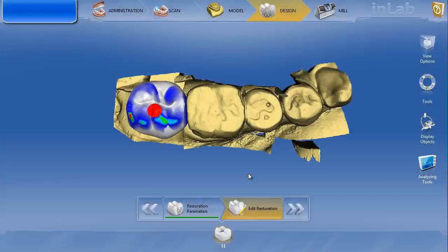So this case was submitted by a doctor for a custom abutment in the inLAB software for tooth number 31. The reason I'm making this video is just to discuss some of the most common issues with getting bad proposals with the inLAB software with abutments. Now if you look at this case, the first step of the custom abutment is of course just forming a normal biogeneric crown. I'm not going to pay attention to the occlusion or the context. You guys know how to fix those.